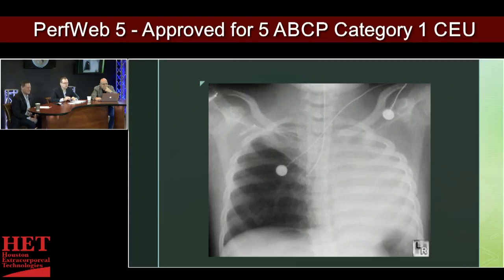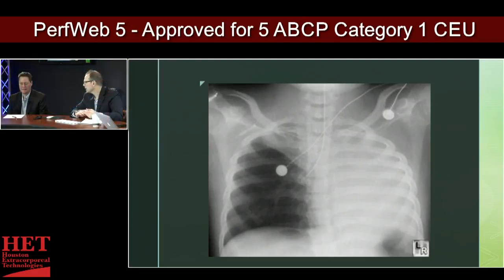Well, in general, these are going to be AP films. And that means that the X-ray is coming anterior to posterior. The patient has the plate behind them, in between them and the bed usually, and that's an AP film. So the things that jump out to me are that we definitely have a difference between the right side and the left side as far as the density.